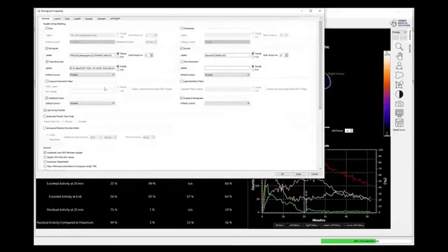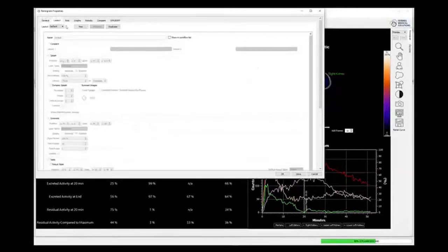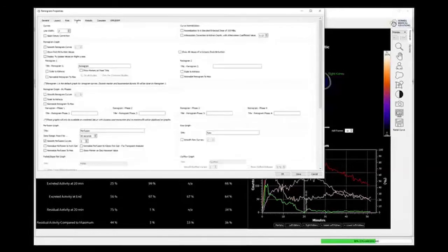So, what else to show you? So there's so many options.